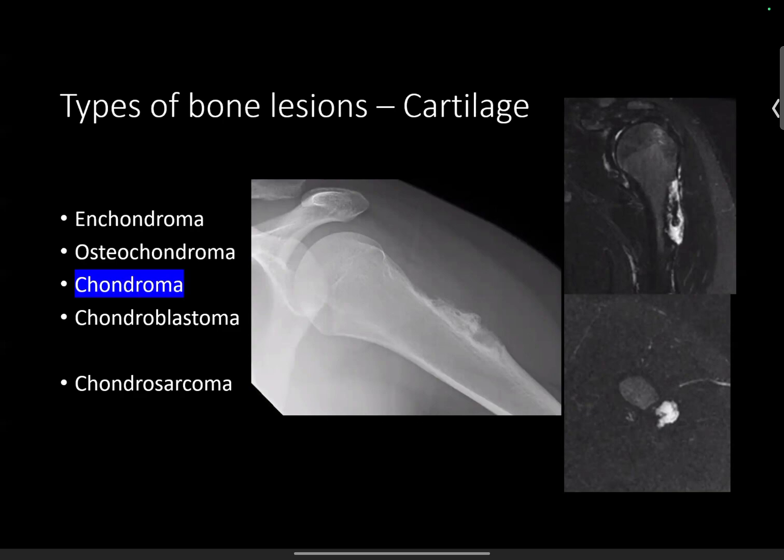Sometimes when you just see a T2 bright lesion on MR, you can be confused. You need to give post contrast. You might have LCH. It really depends on exactly what it looks like, but you can have things that can tease it out. There are some things that can overlap, but you can use multiple imaging modalities. If you see chondroid calcification, that pushes you to a chondroid lesion, whereas if you don't, it will push you to something else.